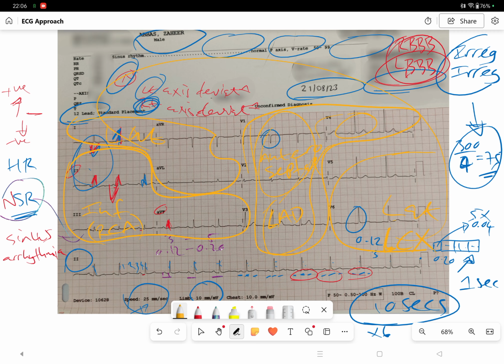As I did say, this was the last bit, but something else has occurred to mind: T waves. I wanted to very briefly mention that T waves, if you notice, are all upgoing deflections. They are positive deflections, as you can see here as I'm drawing these. You can see all these T waves in lead 2 are upward deflections.